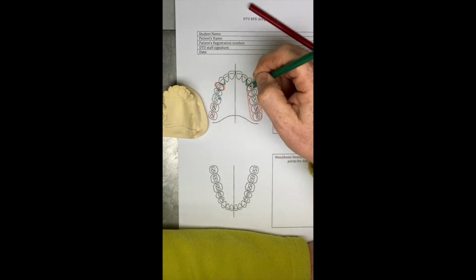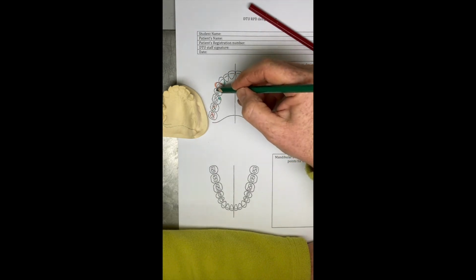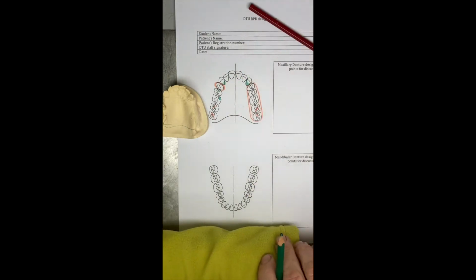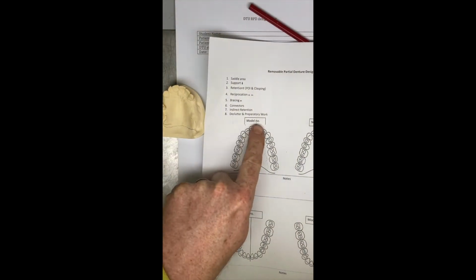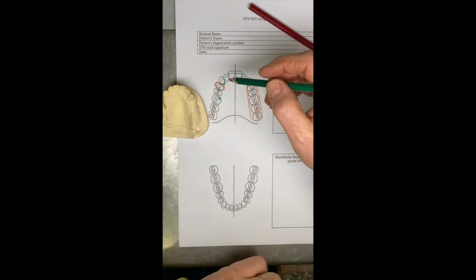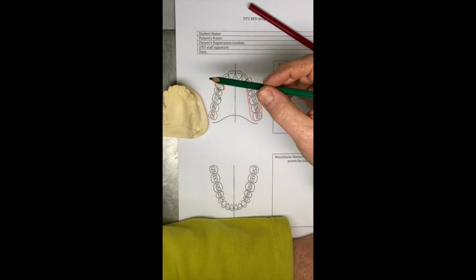So there's our support. Now, by following our rules, I've probably got an additional or unnecessary occlusal rest here, which we could delete later when we get to the decluttering stage. Remember, at the end of the system we've got indirect retention, then declutter and note preparation work, so we might delete that off. So there's our support. Next thing we want is retention.